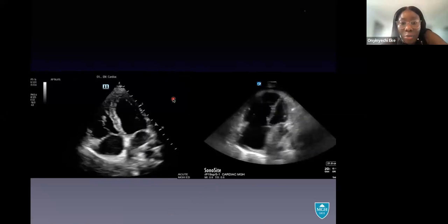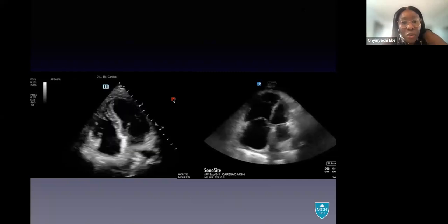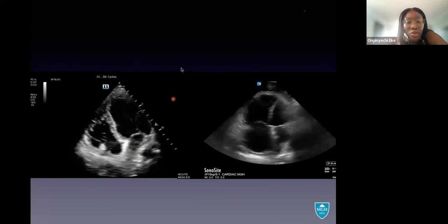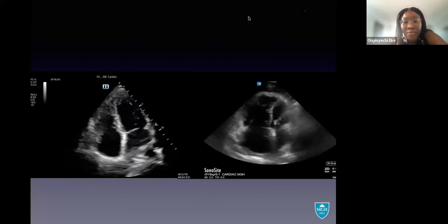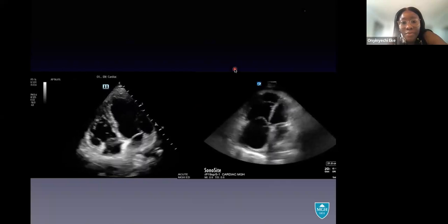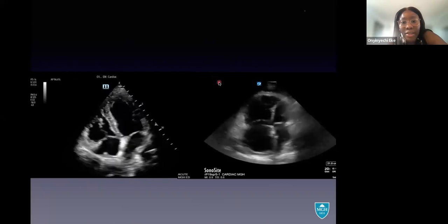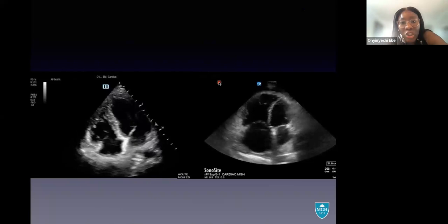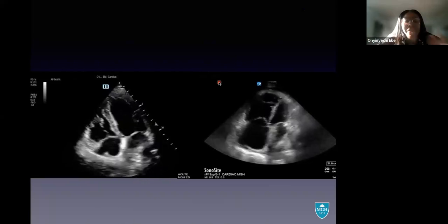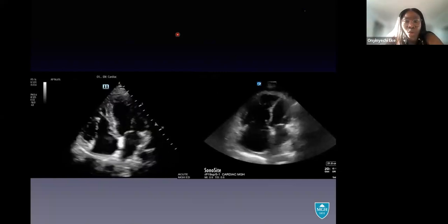Exactly. There's a moderator band on the right, yes. When you say squeeze, what do you mean? Farida, you said the squeezing. I see the moderator band, yes. Exactly. The squeeze for the right side is longitudinal, or up and then down. The squeeze for the left side is in and then outwards. So thank you so much for responding.